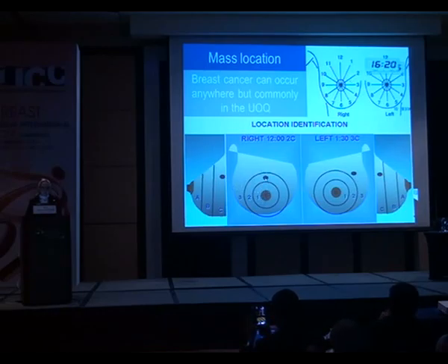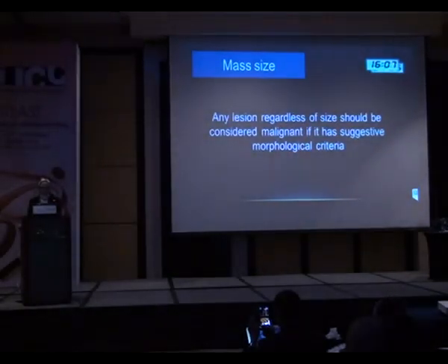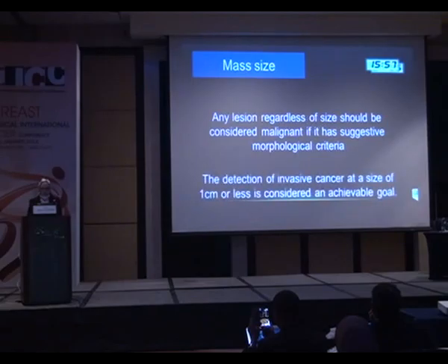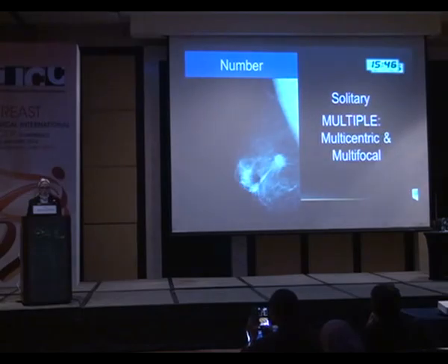You can give measurements from the lesion to the skin, from the lesion to the pectoralis muscle, and from the lesion to the nipple, and this will help the surgeon if surgery is planned. Regarding the size, any lesion, regardless of size, should be considered malignant based on the morphological criteria, not on the size. The detection of invasive cancer at a size of 1 centimeter or less is an achievable goal nowadays. We also have to comment on the number: solitary lesion or multiple lesions, and if multiple, multicentric or multifocal.